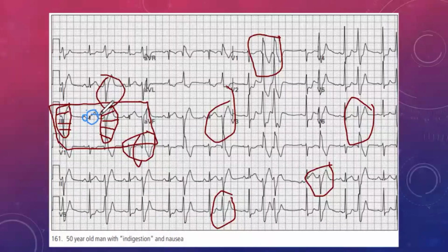So what I'm doing is, once I remove these from my thinking, it might become easier for me to actually pick out what's going on. Now, this is a difficult thing to visualize. So what I've actually done is that I've done it for us on this presentation so that we can go through it.